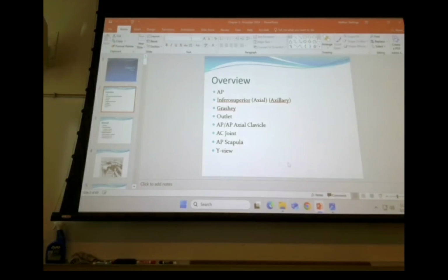Scrolling. And I found it. Okay, so again, some of this stuff we've already talked about, some stuff we still need to talk about though. Some of the things are just going to be positioning tips and hints and things to help you to be able to visualize what you need to see.